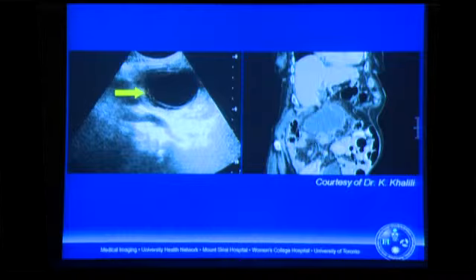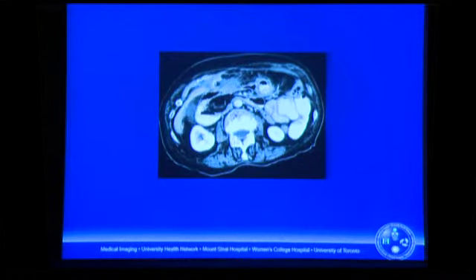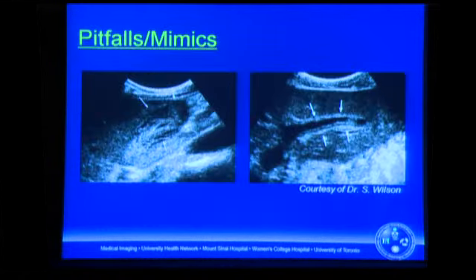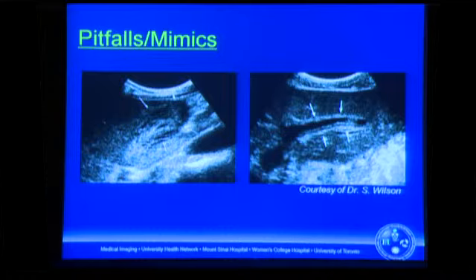So CT is excellent to help clarify. And we realized when we did the CT that there's a neck from that structure going up into the gallbladder fossa. There's some beaking of the structure. And if we look critically at a selection of axial images, we see the cystic artery there with the gallbladder neck wrapping around it. And this is a partial torsion of the gallbladder, which is obstructing the cystic duct, causing gallbladder distension and the patient's clinical presentation.